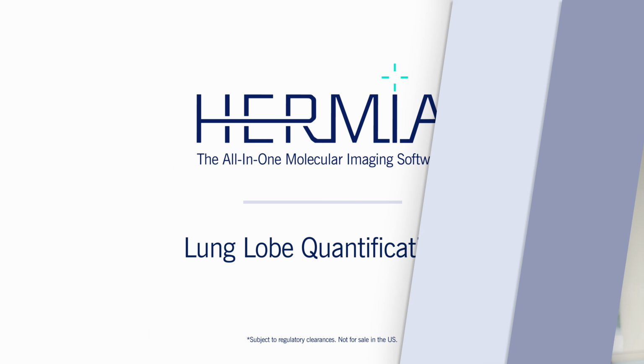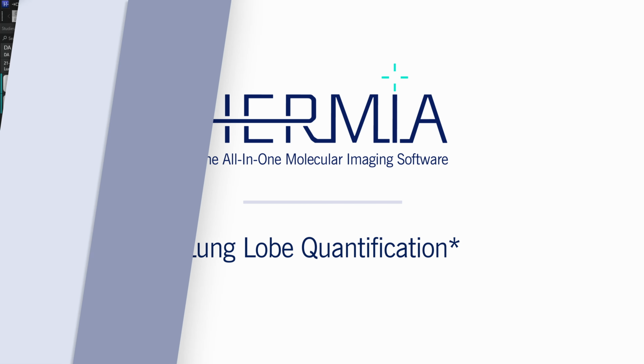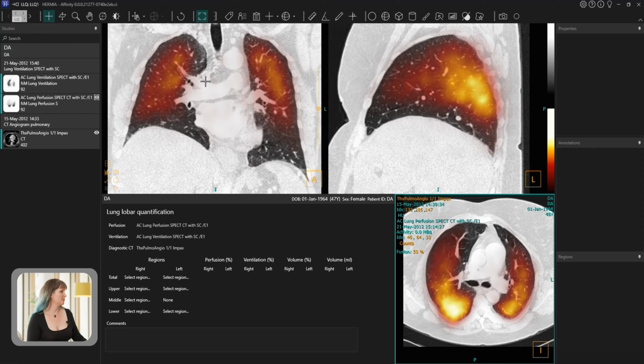Today I will show you the lung lobar quantification application from Hermes Medical Solutions. We have loaded a SPECT perfusion and ventilation scan and a diagnostic CT. By diagnostic CT I mean a CT where you can see the fissures in the lungs. You don't actually need the ventilation if you don't have it. The minimum data set is perfusion and CT.